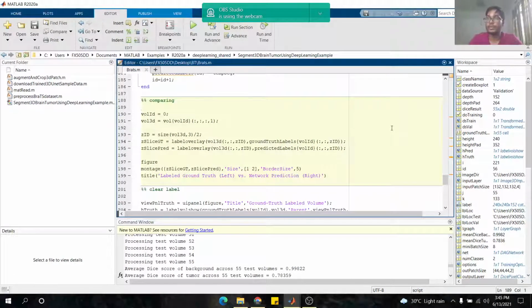Basically, I fed MRI scans and compared the actual MRI scans with the algorithm to see how accurate it is in determining the brain tumor. In FYP1 I did it with 2D images, and in FYP2 I'm trying to do it with 3D images. I started by adjusting the structure.